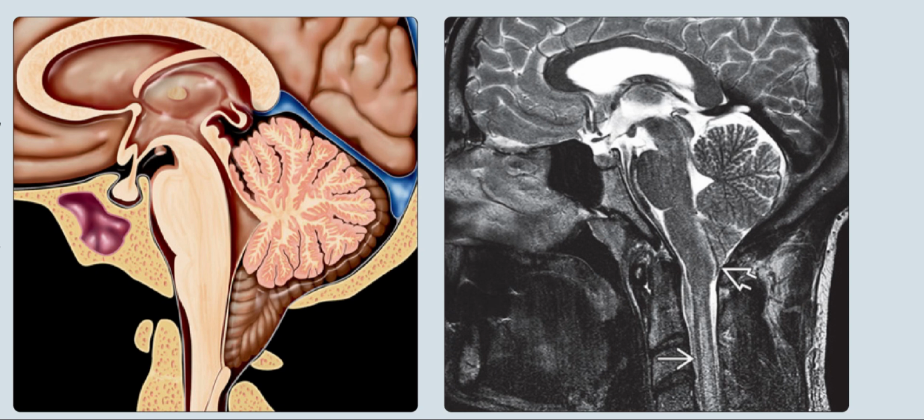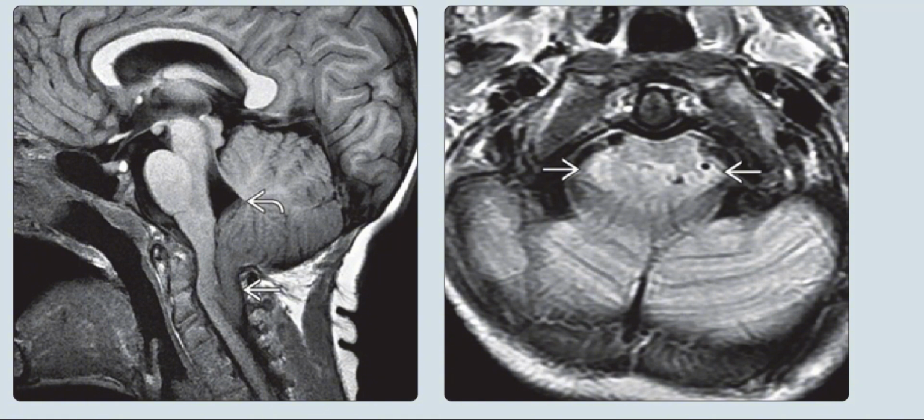In these images, the image on the left is the sagittal T1 weighted MRI, and shows normal fourth ventricle position and appearance as well. The fastigium is in normal position, which is helping to distinguish from the Chiari 2 malformation. There is inferior displacement of the ectopic cerebellar tonsils through the foramen magnum with odontoid process retroflexion and clivus foreshortening.